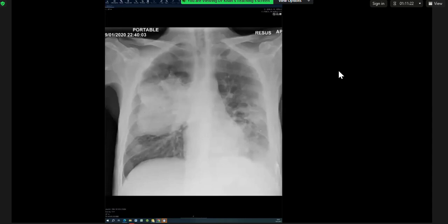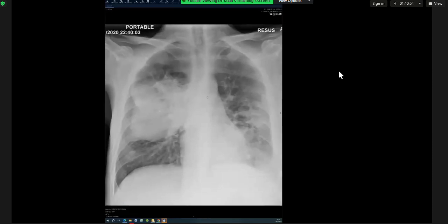So you mentioned bilateral lesions, and you meant this one, and you meant this one? I don't know if you can see my pointer, but there is a large one on the right, and another one in the left hemithorax, in a more peripheral distribution, and more in the lower zone. Okay. I want you to describe these abnormalities a bit more, if that narrows down your differential. You know the patient is unwell. You've said bilateral pneumonic changes, and you said hemorrhage. Are these your two differentials so far?